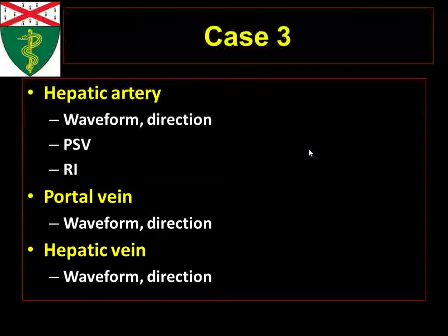So I thought that's a very simple way to tell you what direction things are going. And what about the waveforms? Are we going to see this systolic and diastolic kind of appearance of the portal veins? Joe's shaking his head, so he doesn't believe that. So we're going to see a more undulating waveform that's flowing continuously towards the liver. We'll show you examples of that.